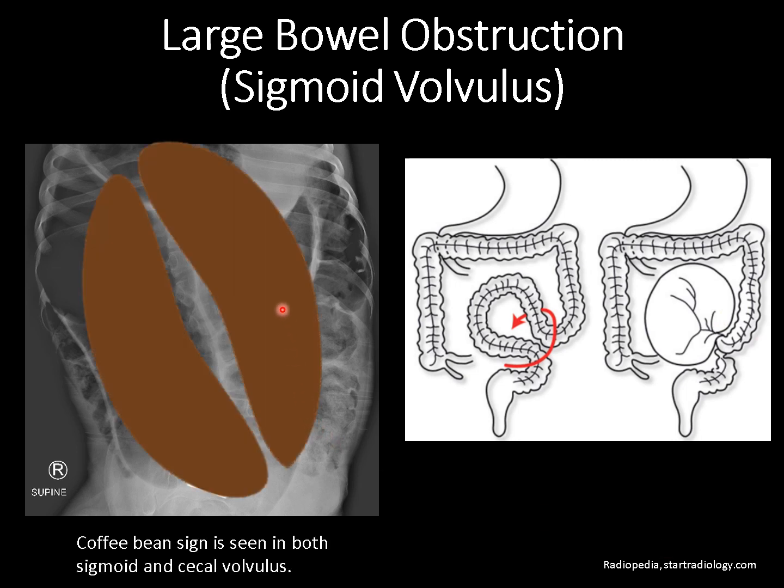And this is just an example of a coffee bean superimposed on that so you can see better what we're referring to with the coffee bean sign.